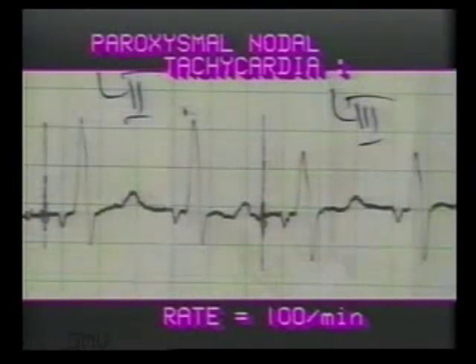This ECG shows inverted P waves in leads 2 and 3 with short PR interval, indicating a nodal rhythm. But the rate is 100 per minute, beyond the normal range of the AV node. So this is called paroxysmal nodal tachycardia.